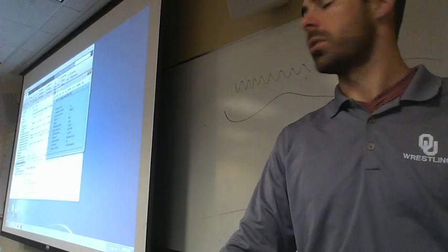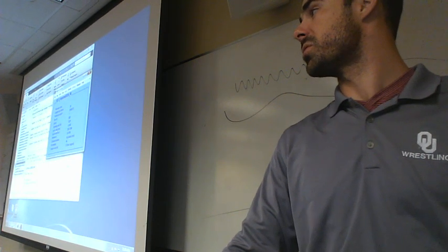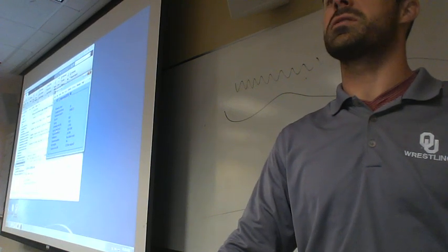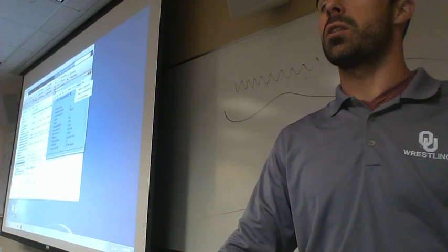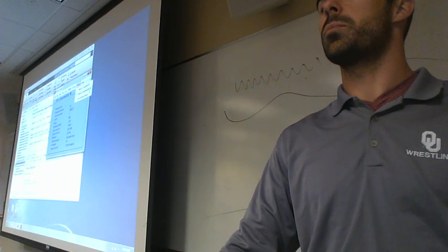The filter? Yeah. Okay, so we just did the high pass filter. So let's say you need to do it again. This is a great example. What do I do? This is our file that finished that we just did. It's filtered. Let's go back one step.